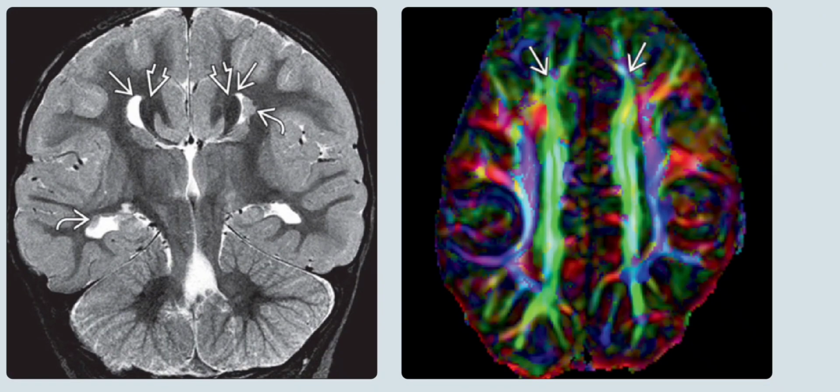So on the left, that's the coronal sequence of the T2 fat-suppressed scan in the same patient, and it shows the characteristic Viking helmet sign of the corpus callosum dysgenesis. The prominent heavily myelinated Probst bundles are also noted. They are also present, as are multiple nodules of periventricular heterotopic gray matter.